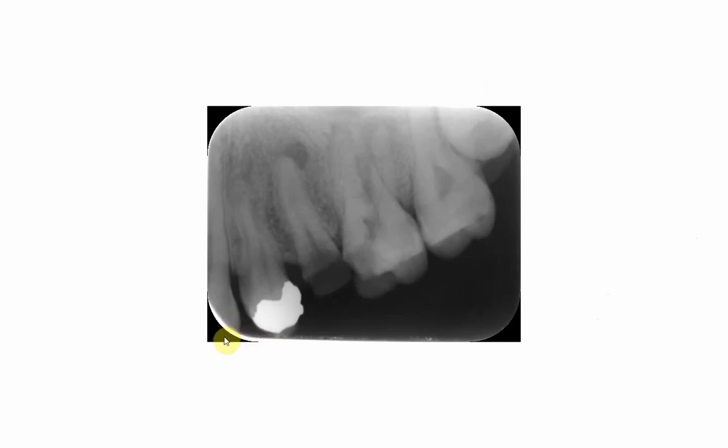Here, in the anterior part of the film, it is less than 2 millimeters, so we have a crown cutoff. But as we go posteriorly, you see that the film is slanted and it doesn't follow the curvature of the arch, so the apical part of teeth is all cut off here. Though the horizontal angulation, the vertical angulation, the cone coverage are all fine, what changes this radiograph to an unusable one is the fact that the film is extending below more than 2 millimeters, and thus we will have a cutoff in the apical area. The same problem here. We overlook the posterior part of the sensor when we place the film, and we only concentrate on its anterior part.